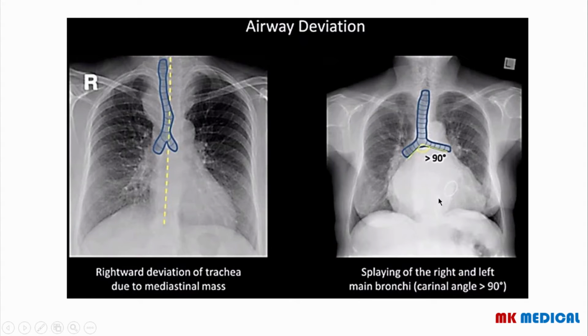And take note also that this X-ray is rather of a woman. As you can see, there are breast shadows that you shouldn't really miss out on the X-ray, because what you see on the left side should obviously coincide with what you see on the right side. So this was most likely a female patient.